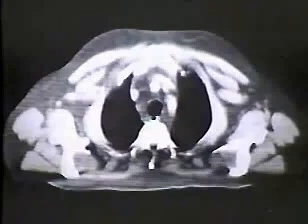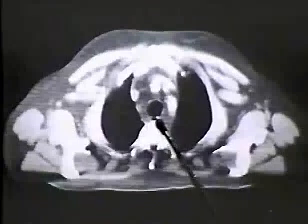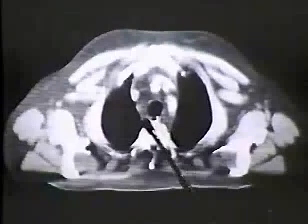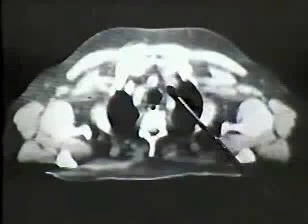Here's another nice example of a variance in the appearance of the esophagus, which on this scan is seen as an air bubble with a little bit of wall around it. As we move further up, we again see the subclavian artery, very small common carotid artery. Now, since we're farther up, the left brachiocephalic vein has not begun to cross the mediastinum, and it's seen more or less end on. The right brachiocephalic vein is over here.